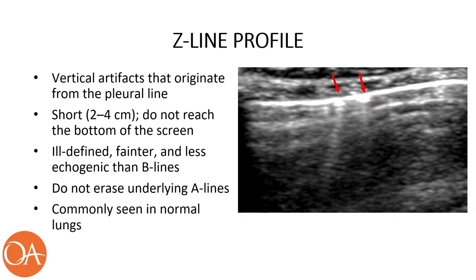In contrast, B-lines are pathologically relevant when numerous, as they may indicate interstitial syndrome. Recognizing these distinctions is essential to avoid overinterpreting normal findings as abnormal.